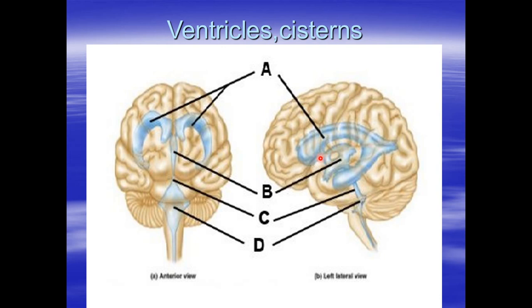So to sum up, this is the lateral ventricle located inside the cerebral hemispheres, and you can see the frontal horn, the occipital horn, and the temporal horn of the lateral ventricle. From here it opens through the interventricular foramen of Monro into the third ventricle, and in the middle the massa intermedia is seen, which is a non-neuronal connection, as we said in the last session.